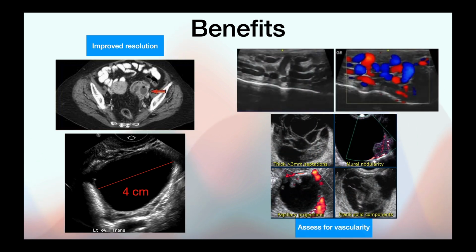Second, you can capture vascular flow by using color and quantitative Doppler modes, which is important in both diagnosing lack of flow, as in testicular or ovarian torsion, as well as increased flow that you might see in infection and inflammation, the itises. Flow in abnormal structures such as cysts may also imply vascularity and an increased likelihood that the cyst is malignant. Last, and this is very important to patient care, is that ultrasound is associated with the least amount of potential harm to the patients.